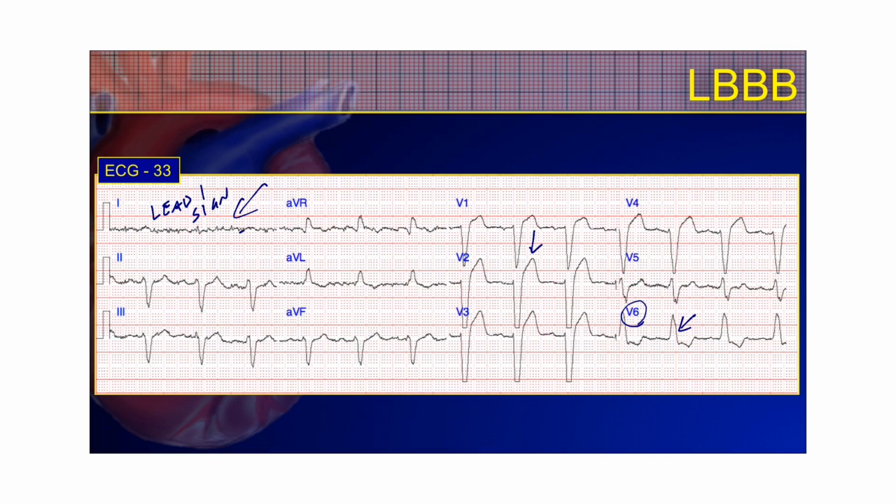So just looking at this left bundle branch block again and these right precordial leads, you do have significant ST elevation. And I say significant because there's a lot of it, not significant because it's an MI. This is all related to the left bundle branch block, and there's not anything on the 12 lead that indicates that this patient's experiencing an acute myocardial infarction. I'm not saying you can't identify an MI in the presence of left bundle, because in fact you can. That was a myth that was commonly taught, but there is something called Sgarbossa's criteria that we will discuss in another video.